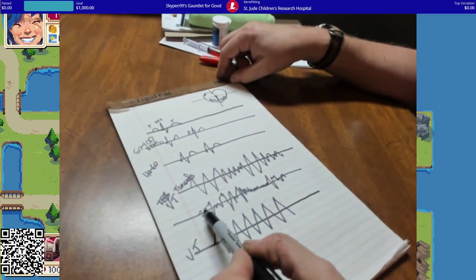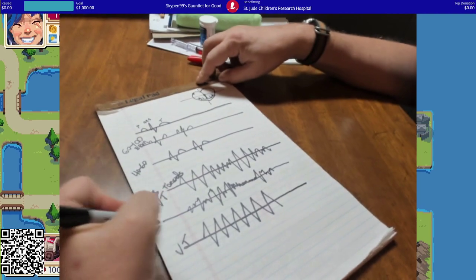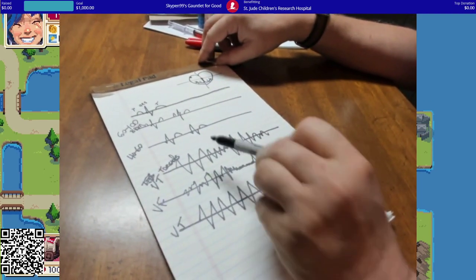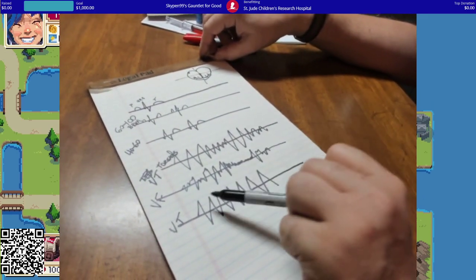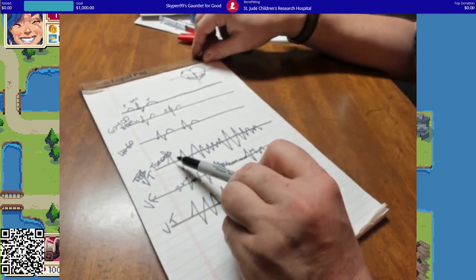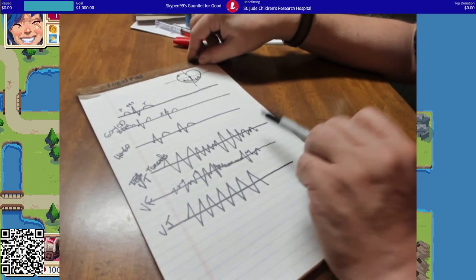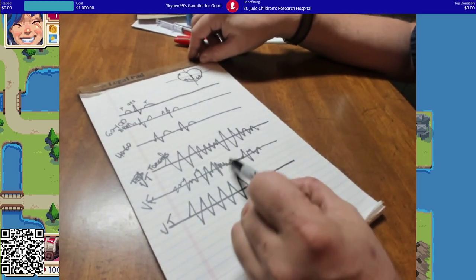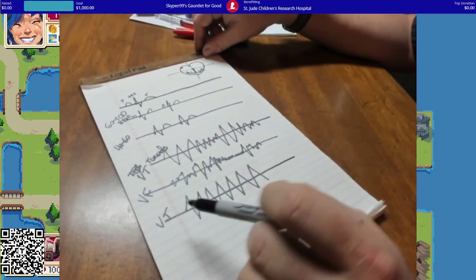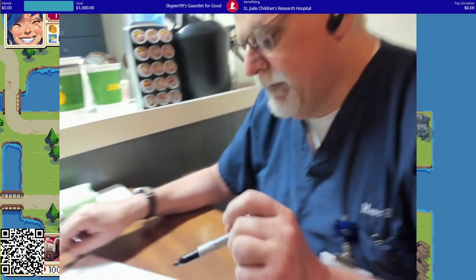Here is your classic Vfib, ventricular fibrillation. Fibrillation is different from tachycardia. Think tachycardia is fast, but this is a ventricular rhythm where there are smaller single spots that are firing. This one you've got all sorts of random spots all over the place that are firing. These two are just a single spot that's going off.